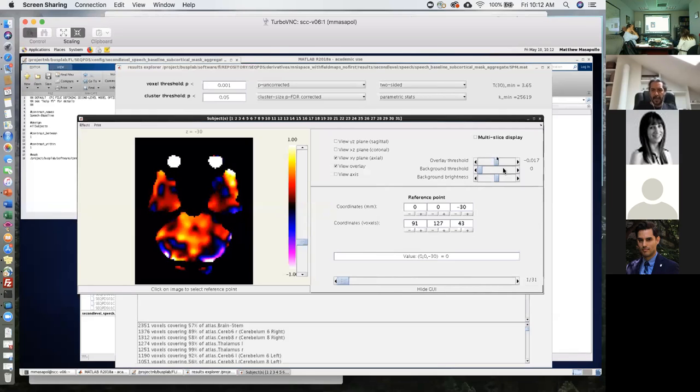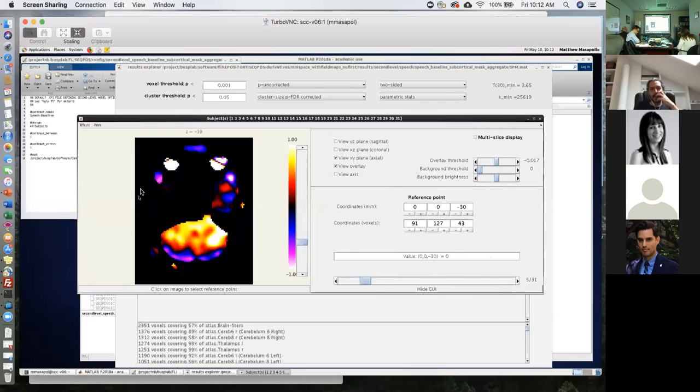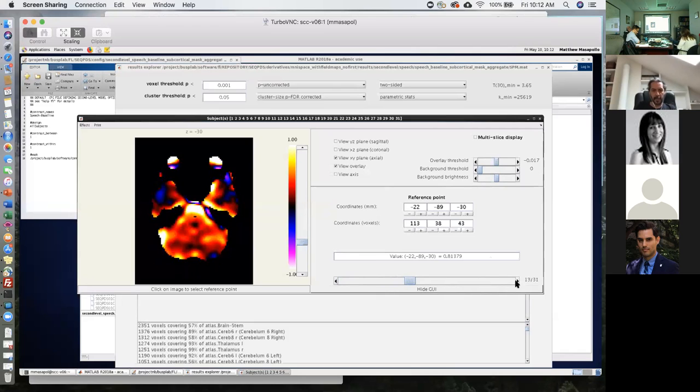But if you look at these brains across subjects at these very inferior portions, we are looking at a portion of the cerebellum, also a portion of the more anterior temporal lobes, and the eyes are the bright things in there. You see that the thing that you see in black here are all of the things that have been masked out at the individual subject level, so regions that are considered to be outside of the brain. And that is not exactly the same region across all subjects, right? If you look at the border where that particular voxel is, then sometimes that is going to be inside of the brain and sometimes that is going to be outside of the brain.